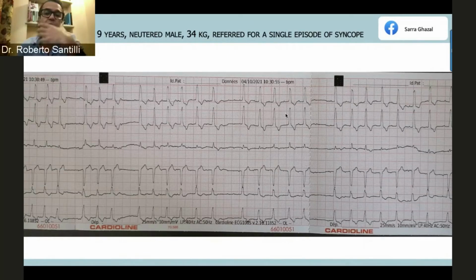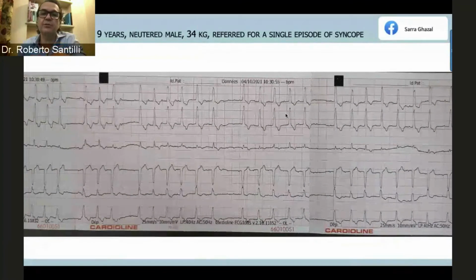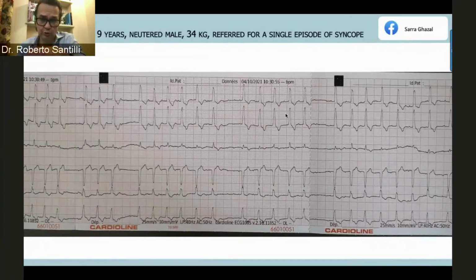As I told you, usually we find trifascicular block in cats with acute myocarditis and transient myocardial thickening. This is the case where you see troponin at a very, very high level. You can actually see 10, 20 of troponin. If you see something like that in a cat with normal troponin and a normal echocardiogram, this is usually a conduction block.